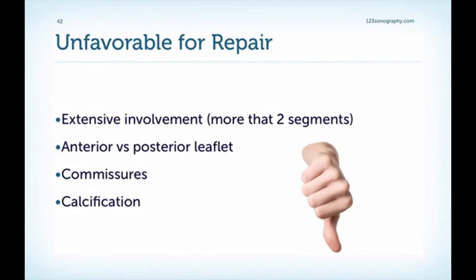Still, it is always a decision of the surgeon, and with the experience of the surgeon, he will also be able to repair valves which seem very difficult to repair. And I've seen fantastic results even in patients who had terrible valves. So you see how powerful actually transthoracic echocardiography is. In most cases, we do not need TEE. In 80 to 85% of patients, I would say transthoracic echo is enough.